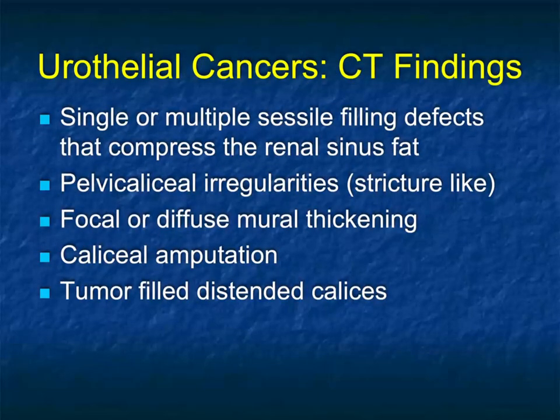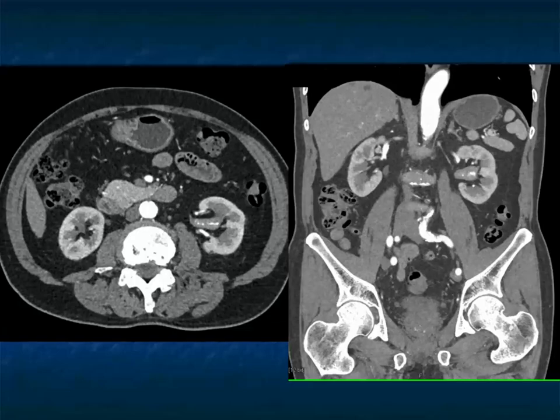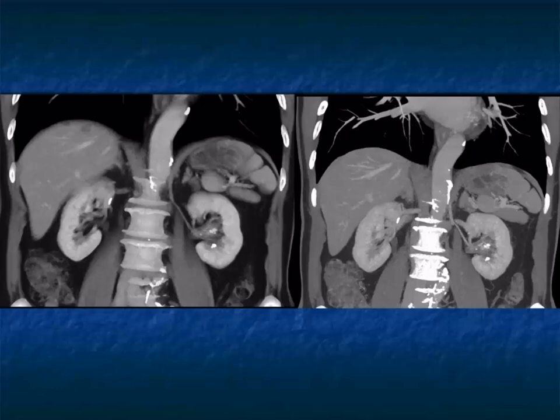Now, the appearance, we spoke about this in the dedicated talks on the kidney, is variable from tiny lesions and strictures to large bulky masses to infiltration of the kidneys where it looks like a renal cell carcinoma. Here's a nice example of a lesion sitting in the left renal pelvis. Faint calcifications. Is this inflammatory? No change in enhancement to any great degree on early phase imaging.